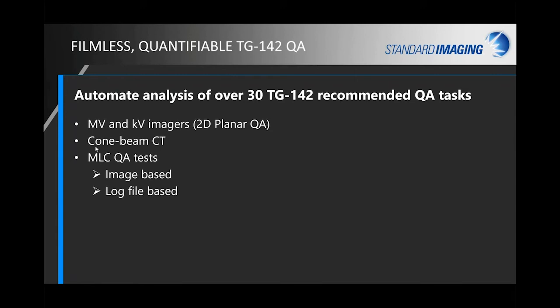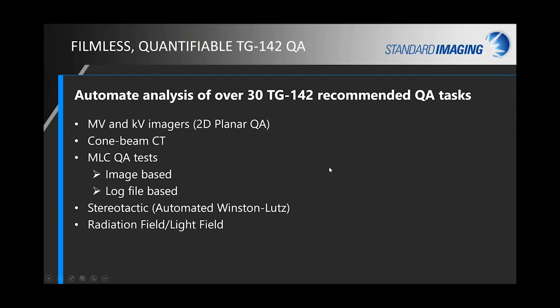So as I said, cone beam CT tests. We have MLC QA tests, both image-based and log file-based. Stereotactic module, which is the automated Winston Lutz test. Our radiation light field tests, our Starshot Analysis test, as well as IGRT functionality as well.